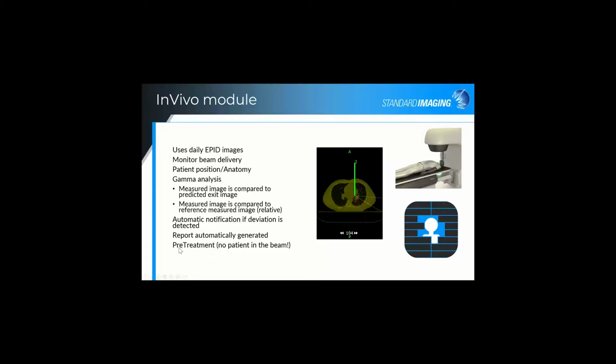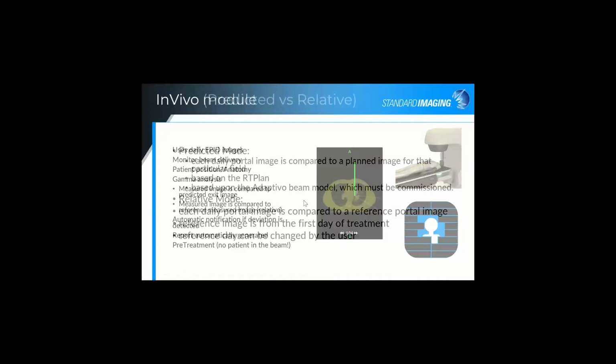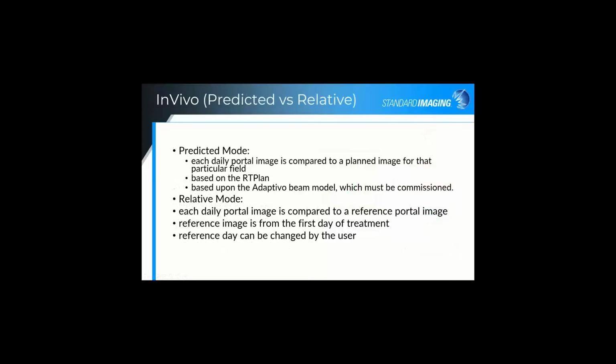the other comment I wanted to make was that for the pre-treatment, it's a very similar workflow. Everything is the same, of course, except that there is no patient in the beam. And so that's the difference between the in vivo and the pre-treatment module.